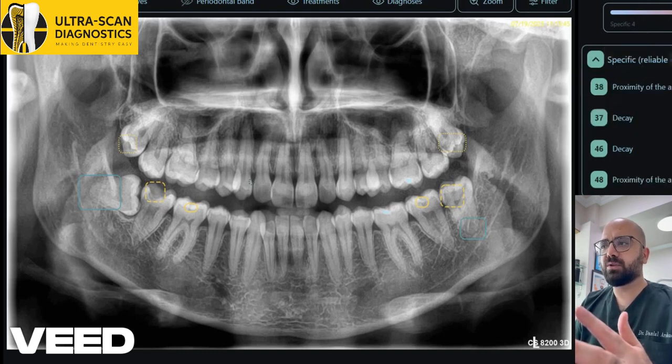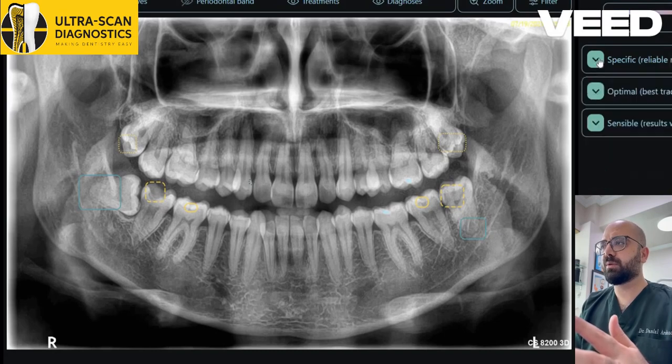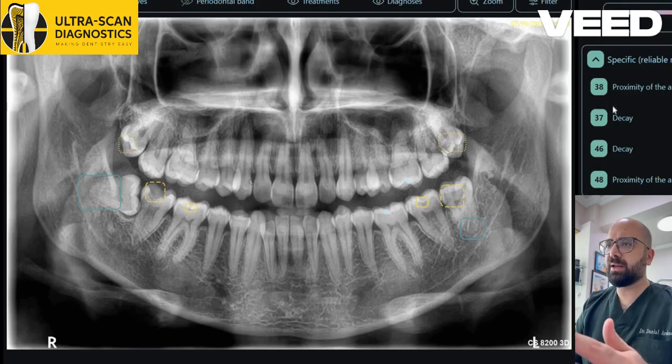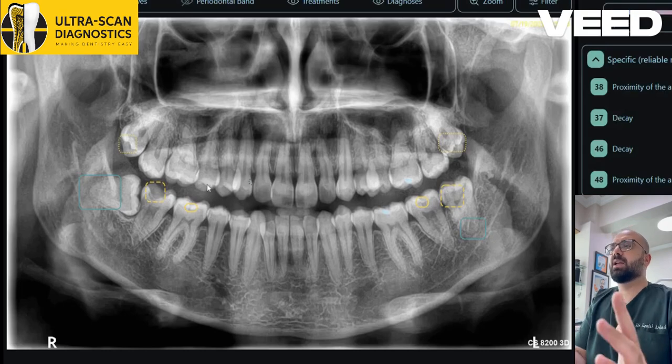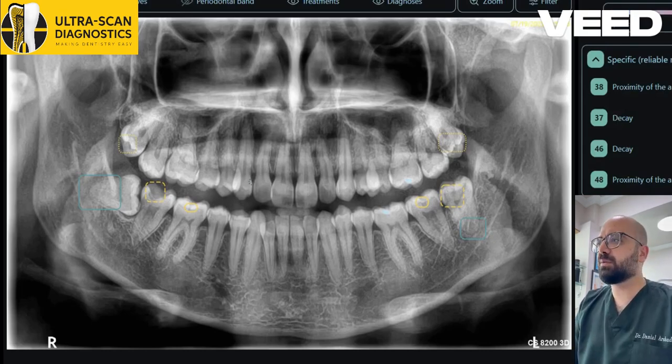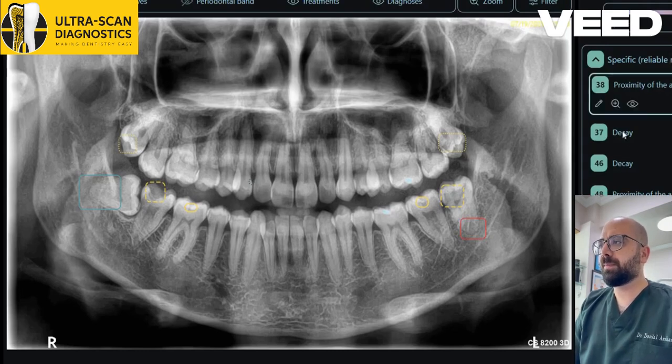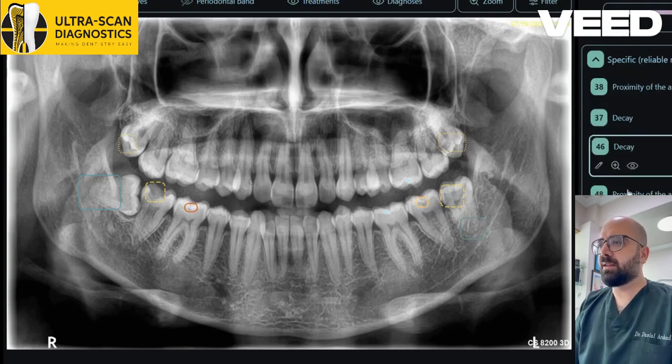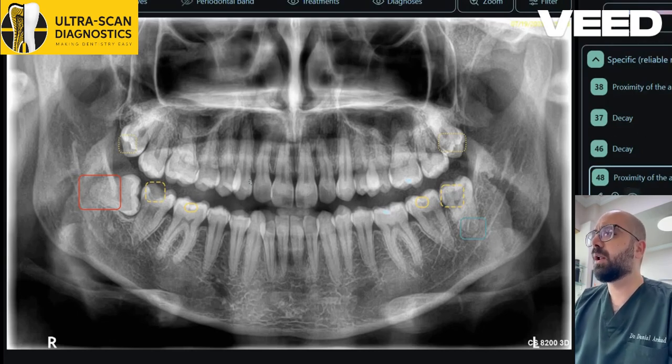So just these 4 things which were very specific: the proximity to the 8, the decay in the 3-7, the decay in the 4-6, and the 4-8. So this is where the AI thought it was absolutely correct. This, and this. So these were the 3 things that the AI was absolutely correct about.